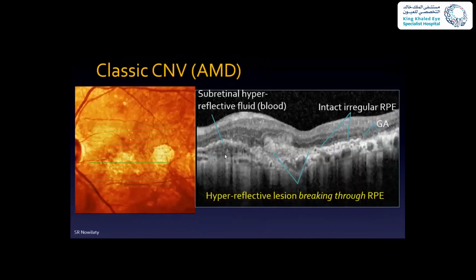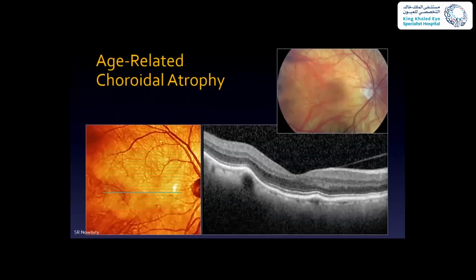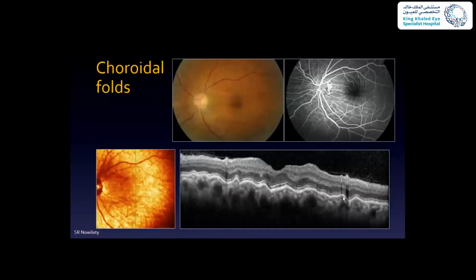But in this case that I'm showing you now, the choroid goes up and down, okay? And you don't see that white line. So you can clearly see the difference now that I've explained it, I hope. Okay, excellent, very clear. So I made my point clear, good.